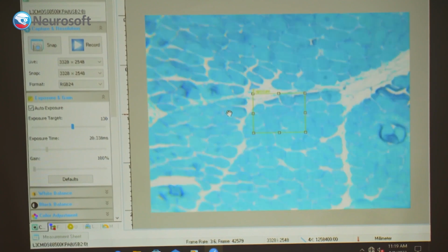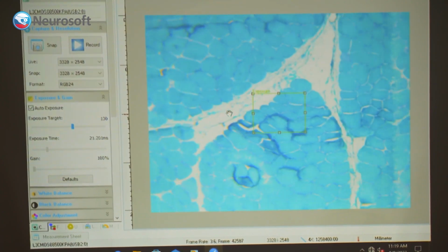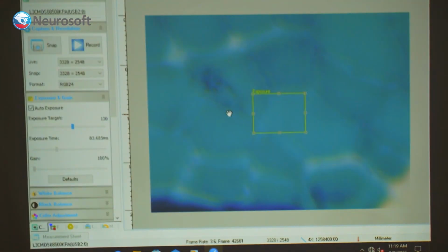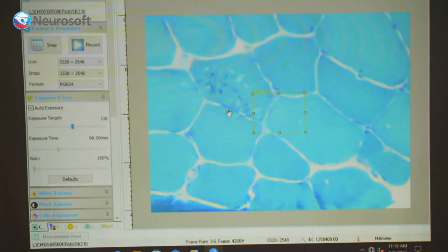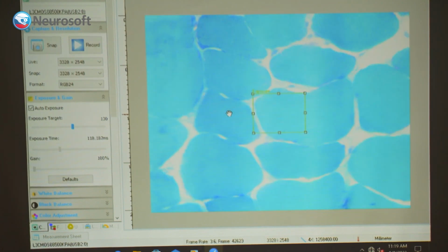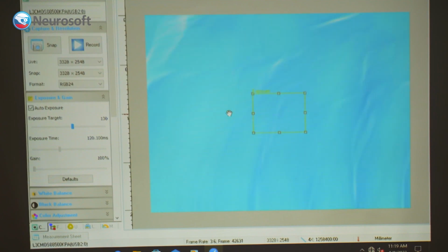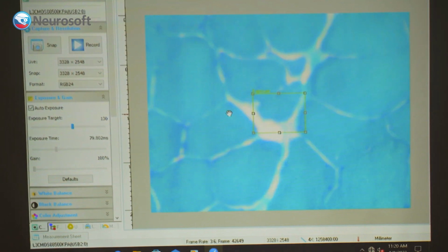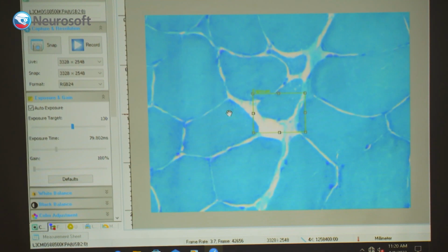If it's not myopathy, in this case it's neurogenic. Yeah, this can be neurogenic, can be myopathic. You can't tell from this one. It's inconclusive. Because the distal SMAs or the CMT, pure motor CMT, if you go to the website, there are so many genes for those. So this could be one of those.